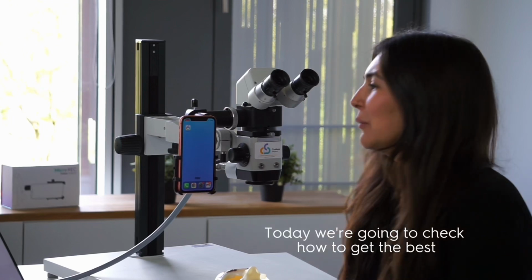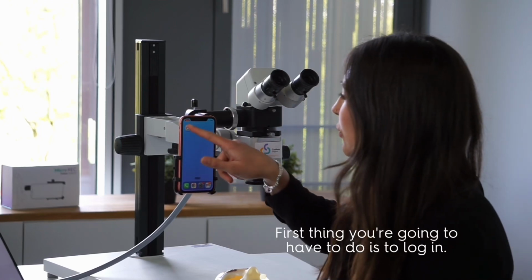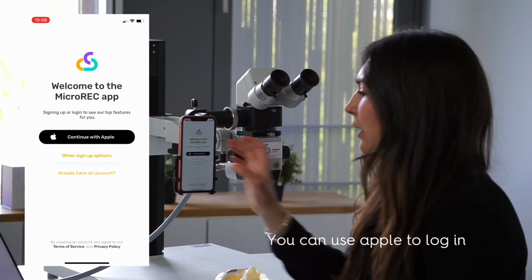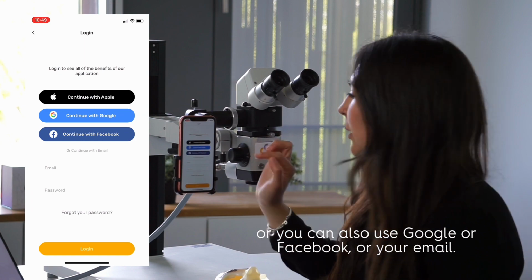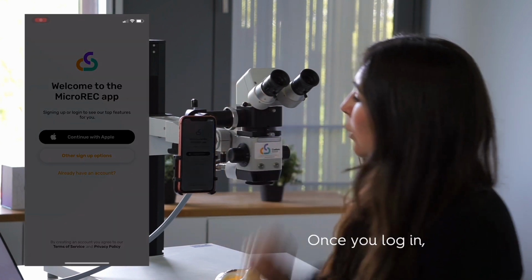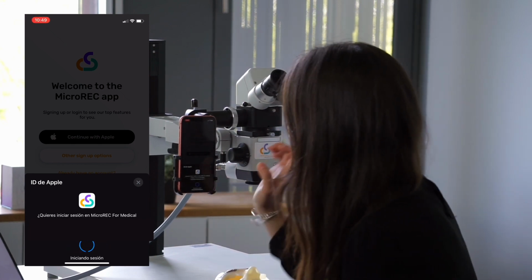Hi everyone, so today we're gonna check how to get the best out of the MicroREC with the MicroREC app. So first thing you're gonna have to do is to log in. You can use Apple to log in, or you can also use Google or Facebook or your email. So any login method works. Once you log in, I'm gonna log in with my Apple ID.